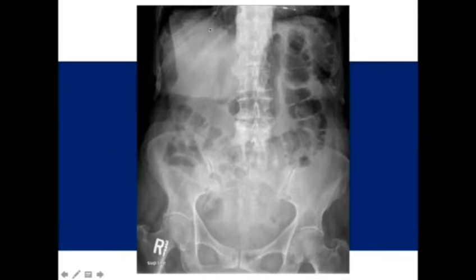So this is the liver and the right upper quadrant. This is the right kidney over here. And the reason why we can see the outlines of these organs relatively well is because there is fat in between them, and that fat is slightly less dense. This here is called the properitoneal fat stripe. Don't worry what it is. The principle here is that the fat is slightly less dense than the soft tissues. Okay, so now that we know the very basics, let's move on to interpreting abdominal X-rays.